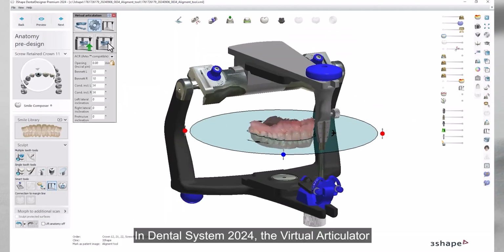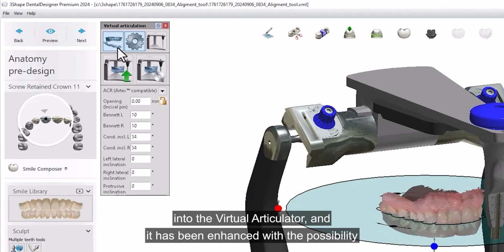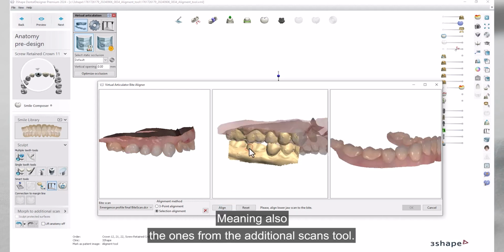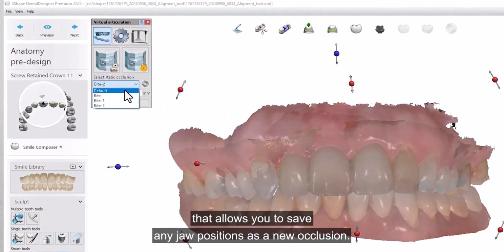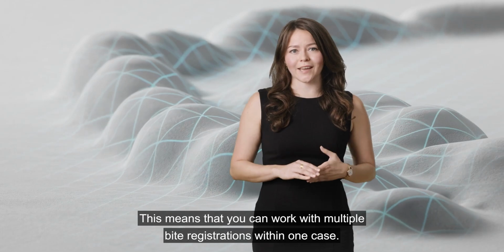In Dental System 2024, the virtual articulator has been transformed into a true power tool for working with bites. Firstly, the bite alignment has been moved from the prepare step into the virtual articulator, and it has been enhanced with the possibility to align jaws to any scans that you have brought into the case, meaning also the ones from the additional scans tool. Secondly, the articulator has been upgraded with a bite memory tool that allows you to save any jaw positions as a new occlusion. This means that you can work with multiple bite registrations within one case.